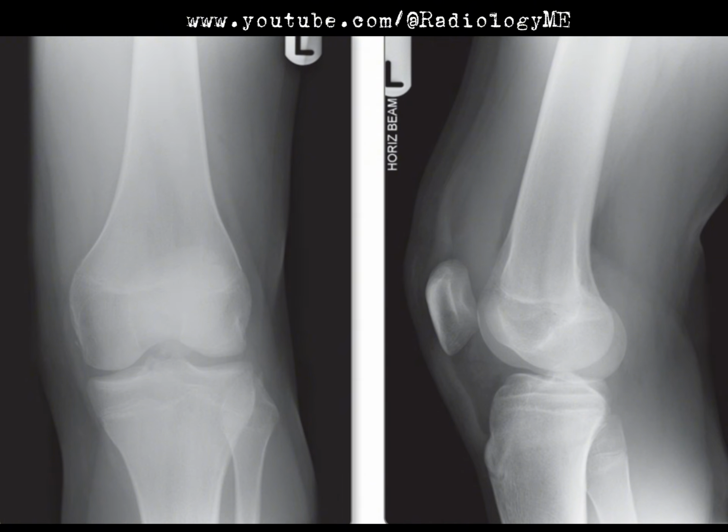Now moving on to the bony abnormalities. There are multiple fracture fragments we need to talk about. One of the fragments is located right near the medial femoral condyle, which could suggest some sort of avulsion injury there. And there's another fragment just hanging out over the fibular head, right next to the lateral tibial plateau. That's interesting because it points us toward a possible lateral tibial plateau fracture.